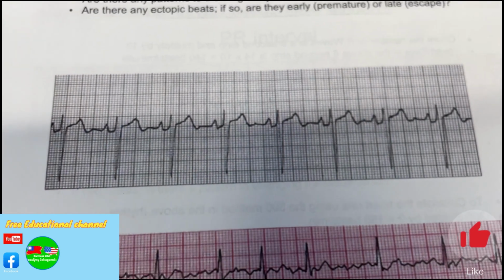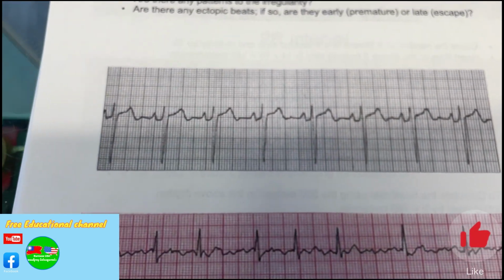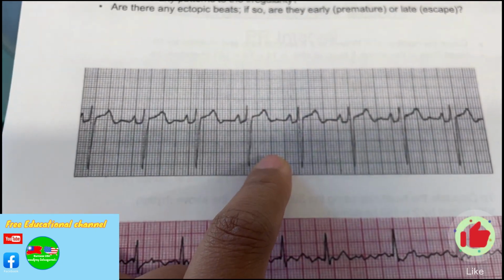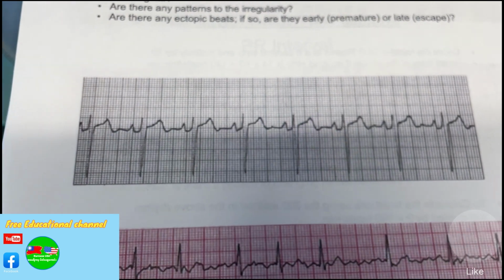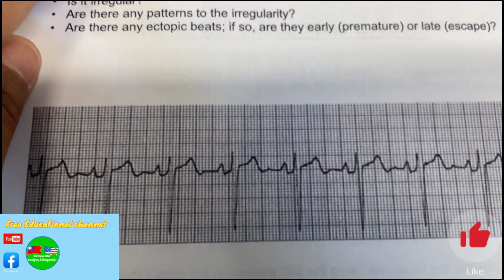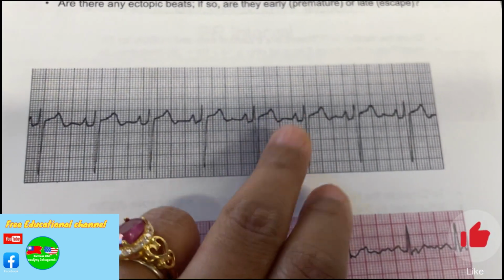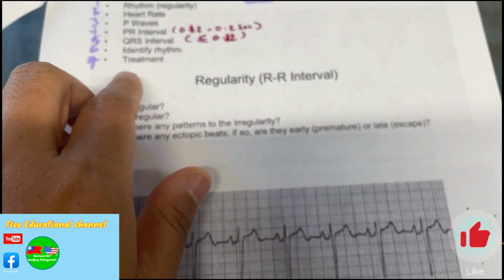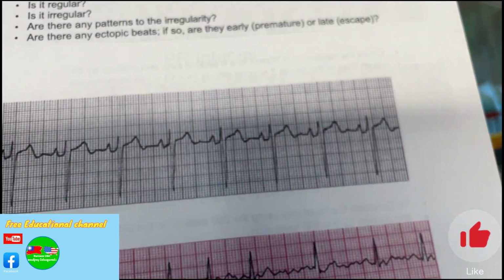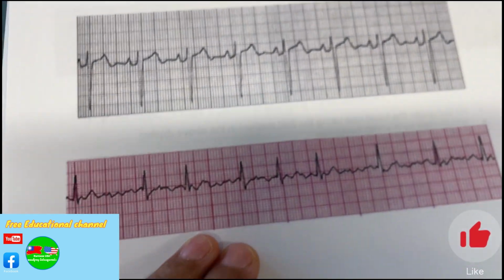The heart rate is good, so you might assume the patient is okay by reading the heart rate, but the patient may actually be presenting with breathlessness or chest pain because of the ST segment. Once you know what it is on the ECG, that means identifying the rhythm and treatment. Like I said, oxygen, and then what else, and discuss with the provider.